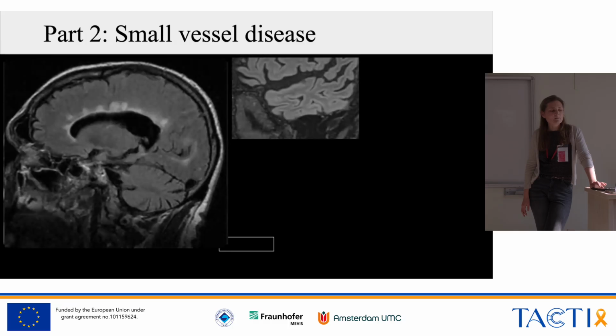Also, we haven't talked about the temporal lobe really. The temporal lobe is like a hidden indicator for MS lesions. It's not an official location, but if we see a lot of anterior temporal lobe lesions, then it's also more MS rather than small vessel disease.